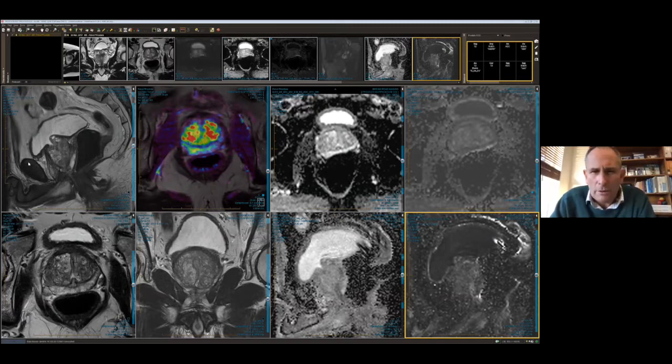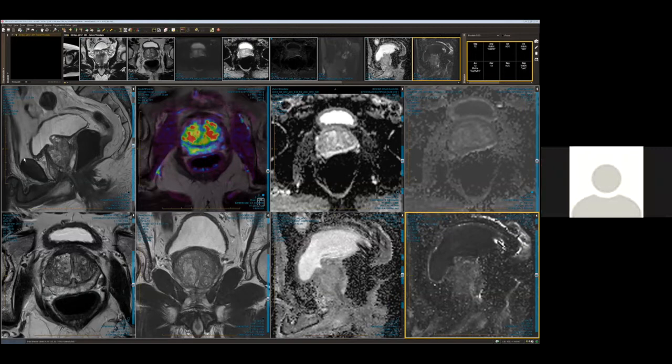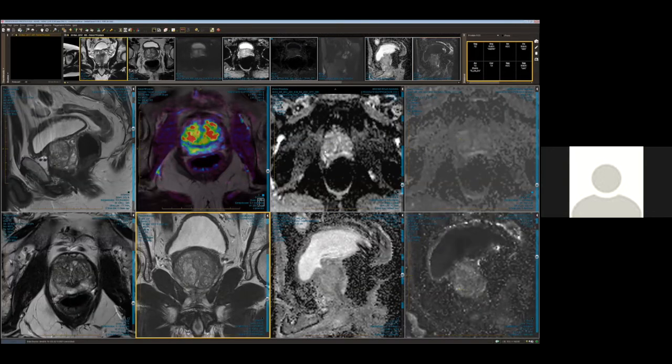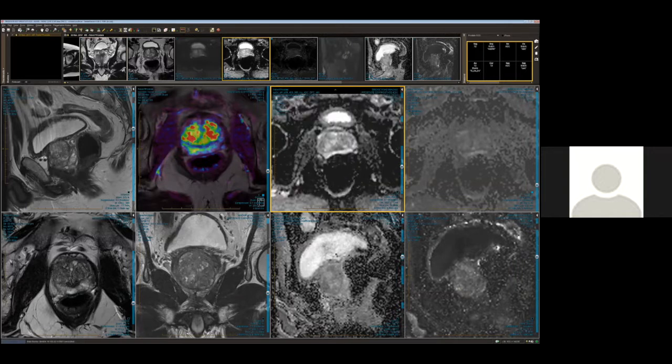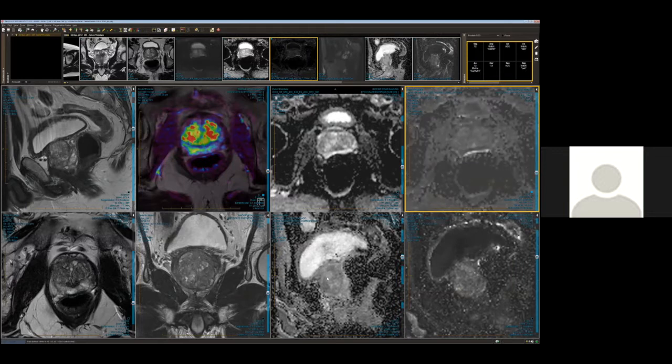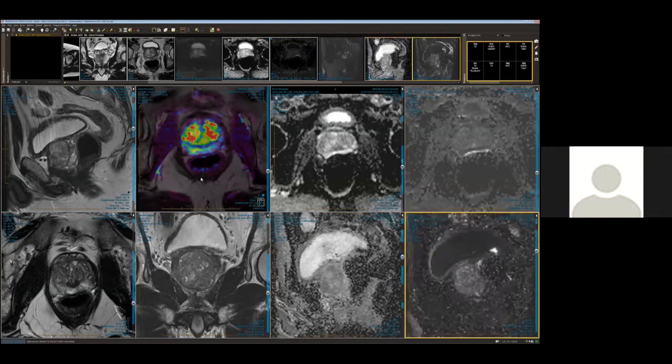So before we go to the next clinical aspect of the history, let's go through this MRI. Richard, are you happy to take us through and highlight the... Sure, this is how I set up the system. This is how we scan the patients. We do 3 plane T2s, a sagittal in the top left-hand corner, bottom left-hand corner axial T2 and a coronal T2. And then we do diffusion in 2 different planes. The ADC is in the upper right-hand side. And the high B value, we run it at a B value of 1400 on the axials. And then we do the same again on the sagittals, the ADC here on the bottom left and the high B value on the right. And we give all the patients contrast as well.